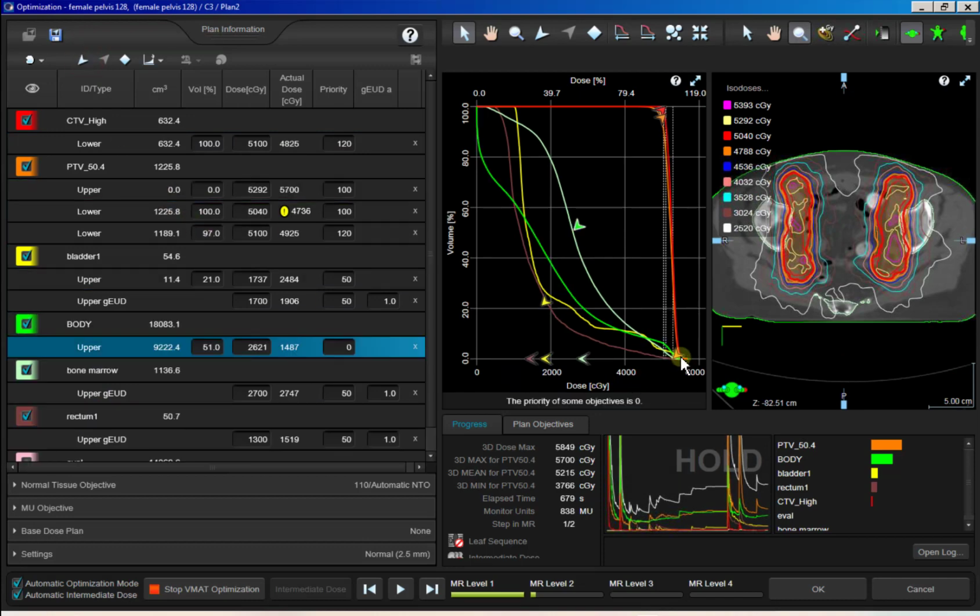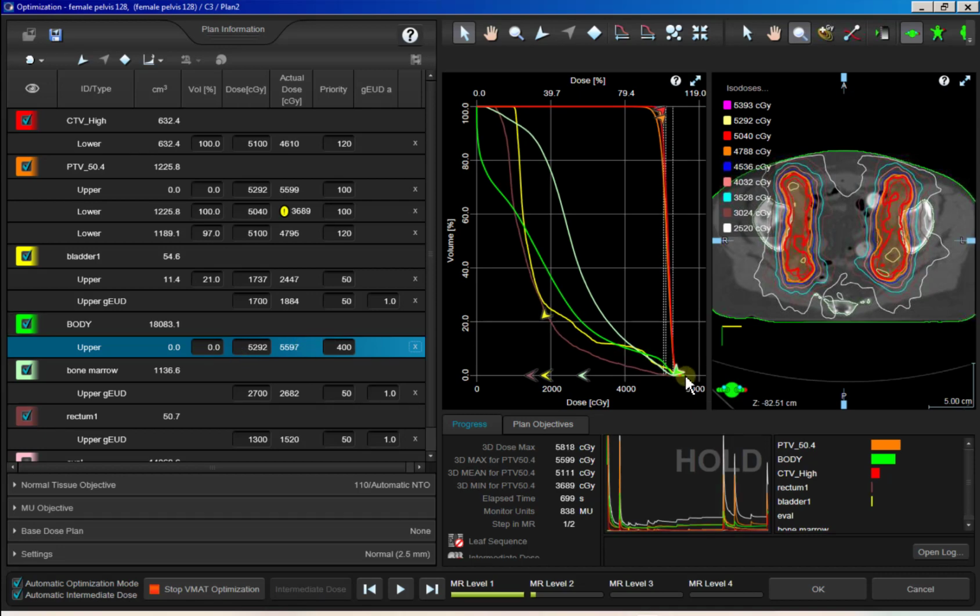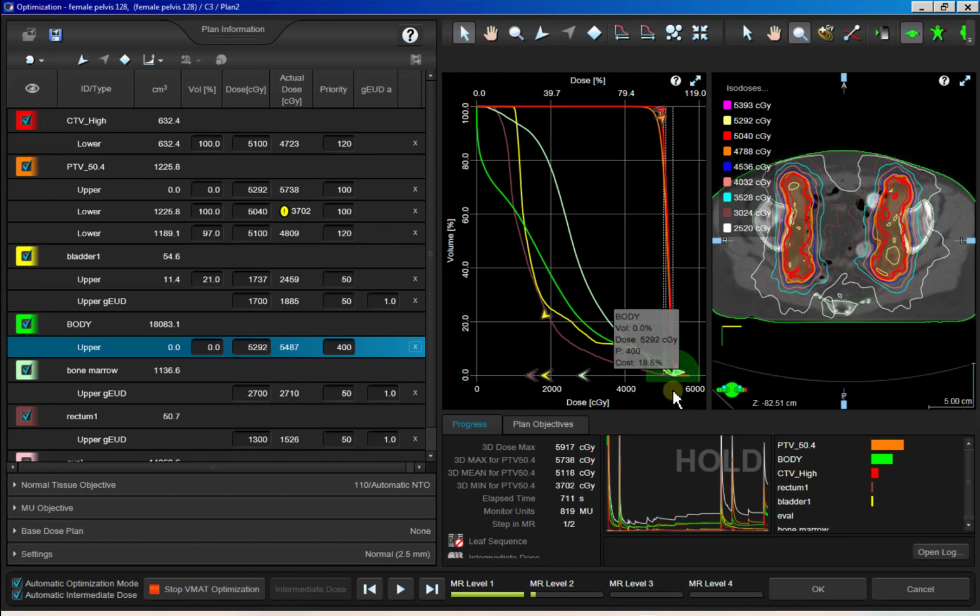last but not least, you see we have this tail down here. Pretty good hotspot, right? 58, 54. It's pretty hot. 0%, 105%. High priority, 300, 400, something like that. It'll almost instantly get rid of that hotspot. If it doesn't, if you let it start to level out and it doesn't, so like in this case, we do have this hotspot, but we added bolus. So before you start really cranking on this body, so I was going to say if it doesn't work, you just up this by another 100 and eventually it's going to work.